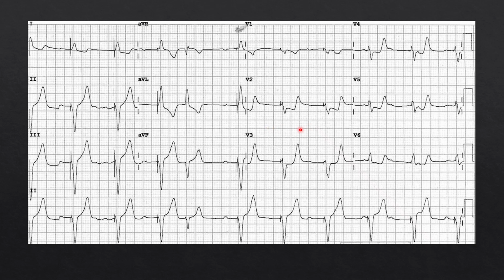So we have the normal discordant pattern of a downward QRS and upward T wave. However, the ST segment is down as well. So the QRS is down, the ST segment is also down, which doesn't make any sense if what we would expect here is some slight elevation or isoelectric presentation, not the downward QRS and downward ST segment.